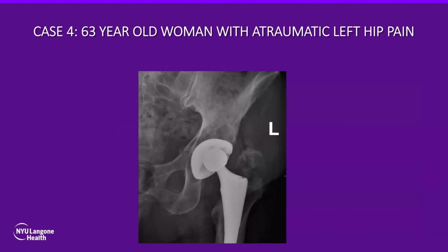So going back to our case, in this case, I see that the femoral head is not right at the center of the cup. It's eccentrically positioned. And I know that there is a polyethylene liner here. So to me, it tells me that there is some sort of liner wear or liner loss over here. So in my mind, I'm thinking I have a liner and there is wear of that liner. So could this be particle disease?